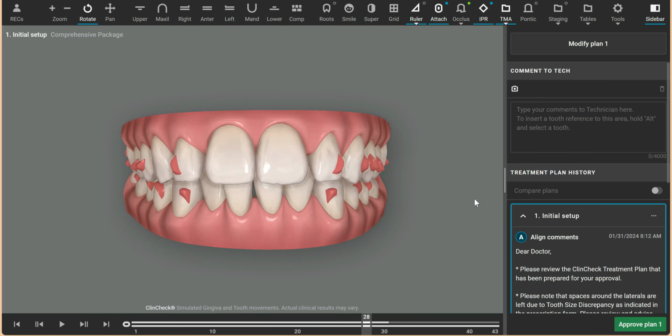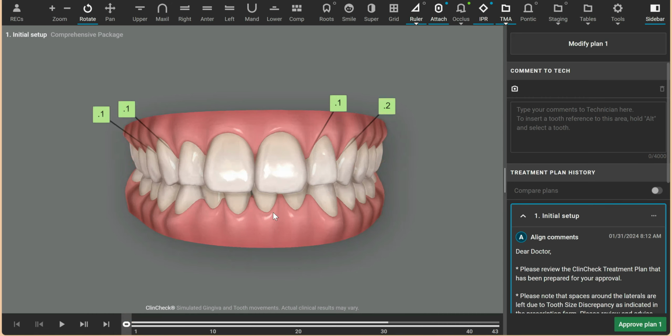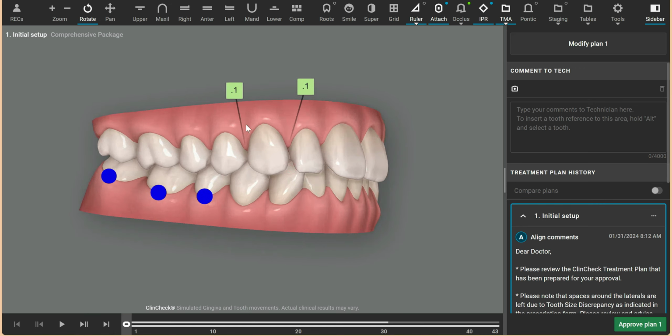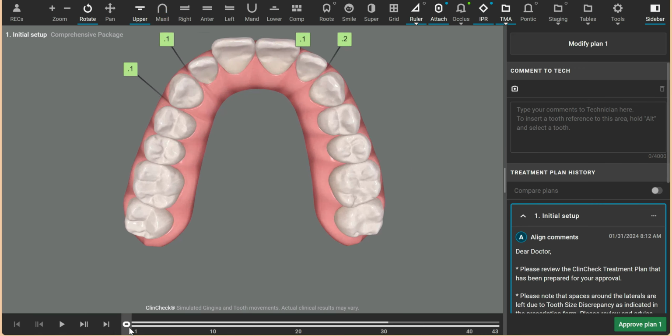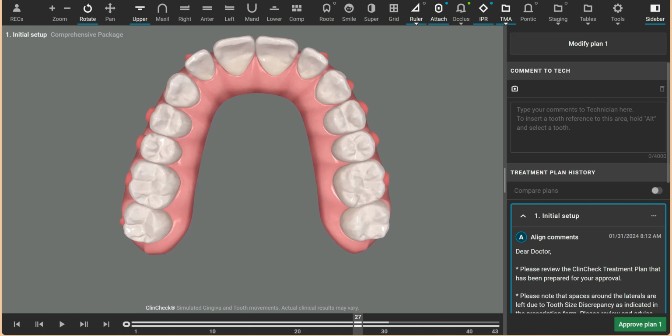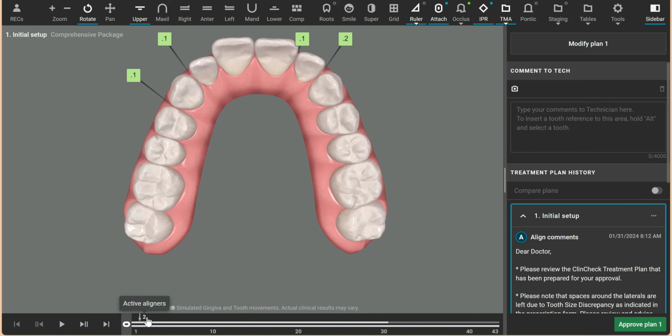This is a 28-year-old female patient. So she has a deep bite. She also has some spacing, by the way. I'm looking at everything at stage 0. Her arches look pretty good, actually. Very little change in her arches, although they do move posterior teeth a lot. And I usually like to dial back posterior tooth movements, especially if they're unnecessary.